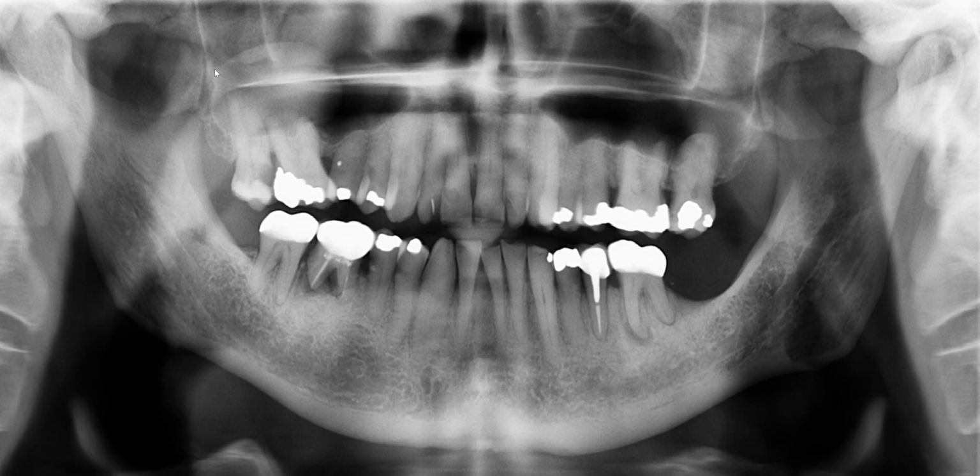We often use the term dome-shaped radiopacity, and it appears to be sitting right on the floor of the right maxillary sinus. So I'm tracing the wall of the maxillary sinus, and this is sitting right on the floor of the maxillary sinus.